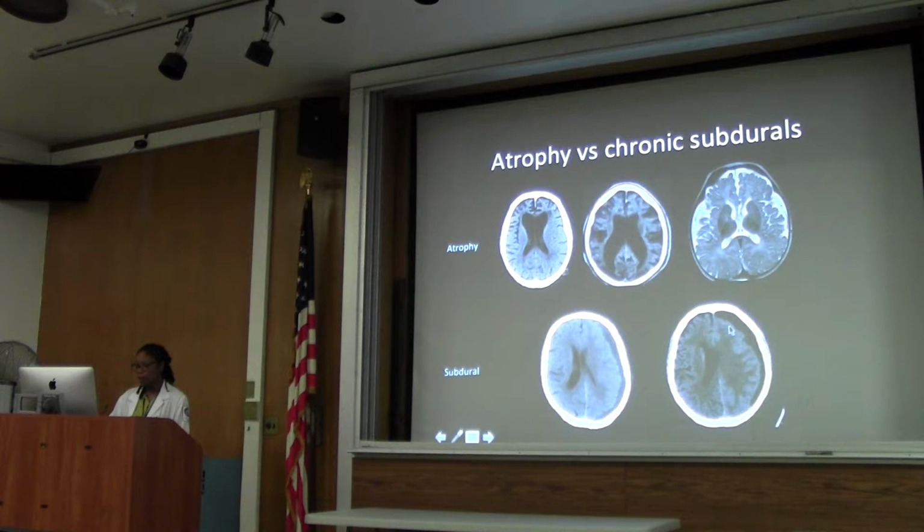So here we said these are subdural collections as opposed to just normal atrophy. Okay, any questions there?